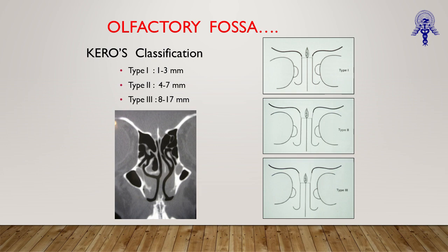Next is assessing the olfactory fossa. Again, everything is given here, but can anyone tell me what is the implication of understanding the depth of the olfactory fossa?